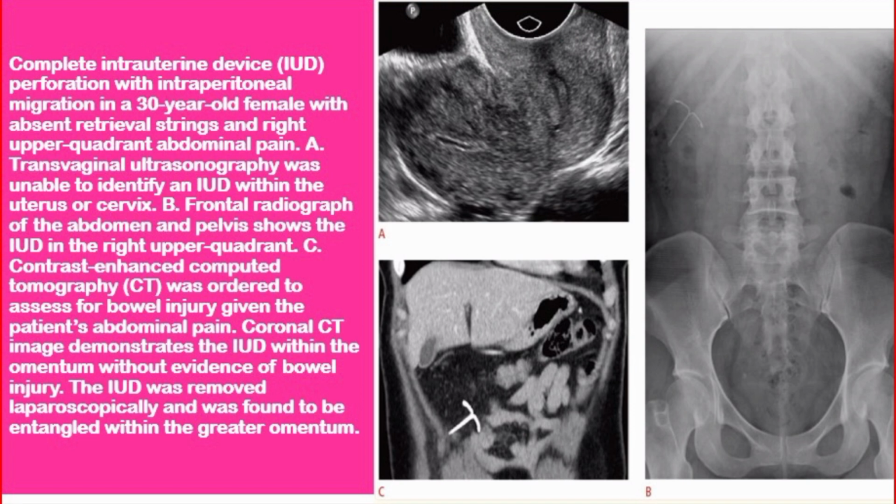C, contrast-enhanced CT was ordered to assess for bowel injury given the patient's abdominal pain. A coronal CT image demonstrates the IUD within the omentum without evidence of bowel injury. The IUD was removed laparoscopically and was found to be entangled within the greater omentum.